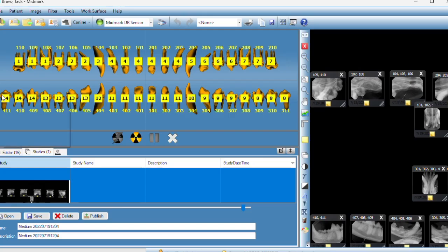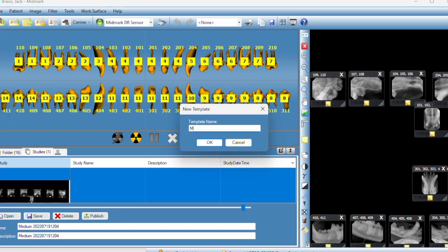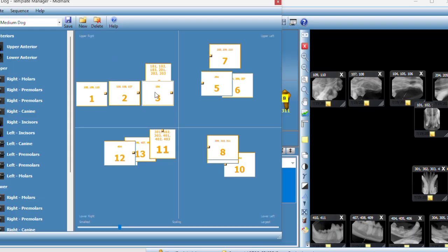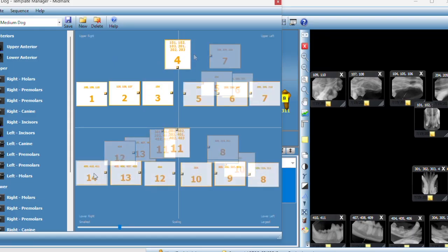And so this is nice for those in between kind of larger, smaller dogs, corgis, Shiba Inu, maybe a medium beagle type breeds. So those in between breeds that a small chart just won't cut it, but we don't need the large chart with all of those extra spots. So again, we'll just arrange this so it's a nice, neat layout, and we have our medium dog template.